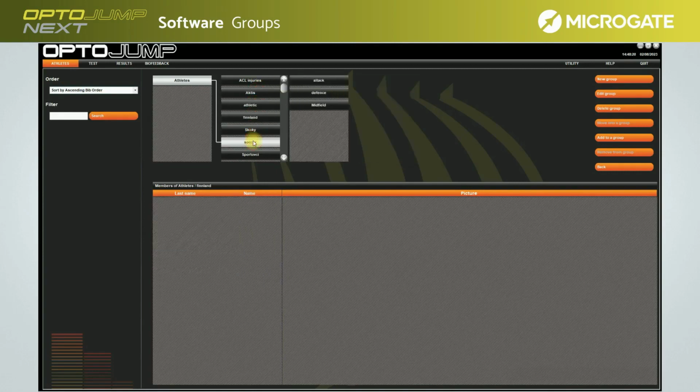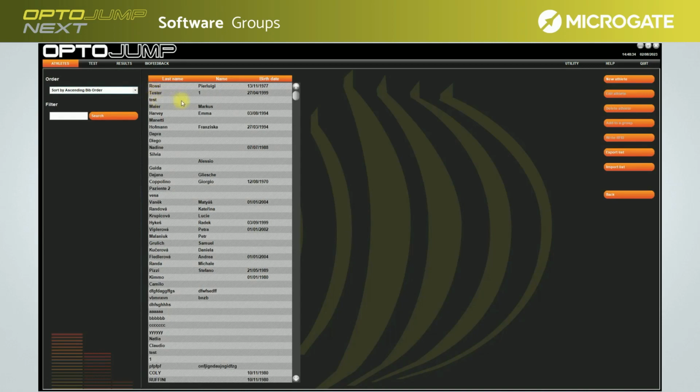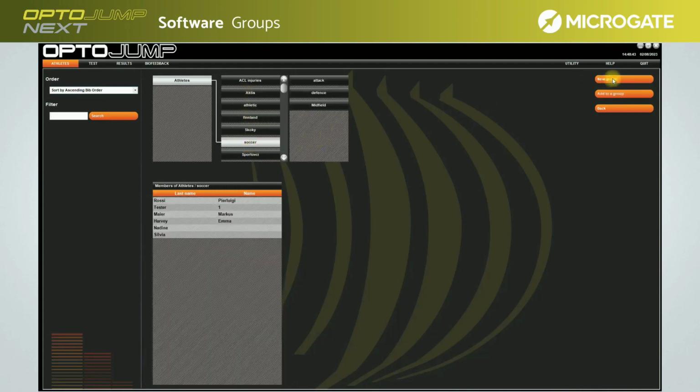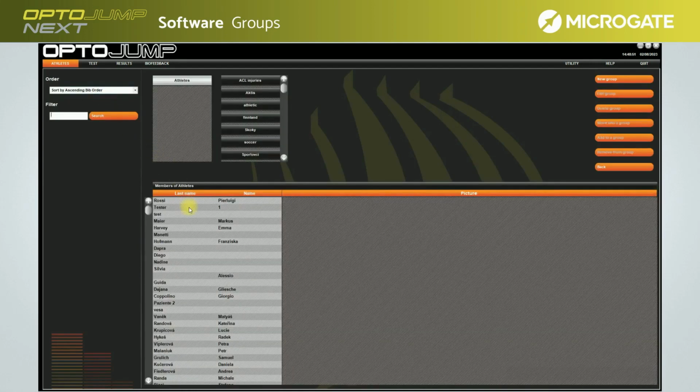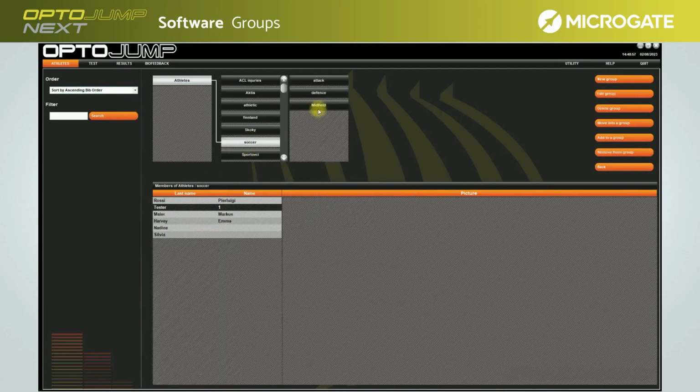There are two ways to manage athletes according to this section. The first, in the Athletes section, by selecting one Athletes tab, it is possible through the Add to a Group icon to choose which group to assign the athlete to and press Add to a Group to confirm. The second way is via the Group Management page. You select the relevant group or subgroup, then drag the athlete's name into the desired subgroup. In this way, it is also possible to move athletes into one or more subgroups.